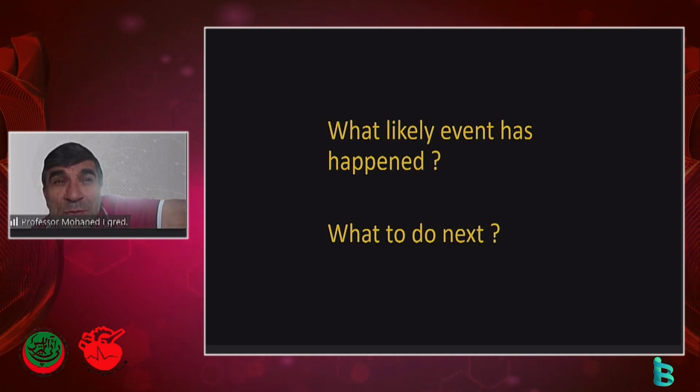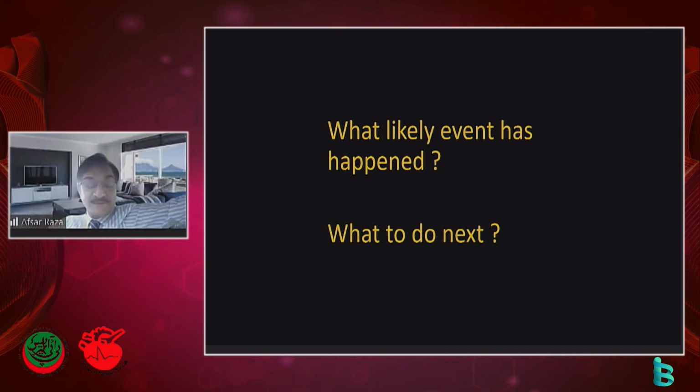with the left main completely blocked just after removing the catheter, and by taking the second one and giving nitrate it opened up, or this is a dissection, because that LAD looks like there's an abrupt occlusion. Whether there's a thrombus or not, it looks maybe like dissection, and maybe there's an ostial left main dissection. Right. Any other thoughts? Let's see the others. What do others think?